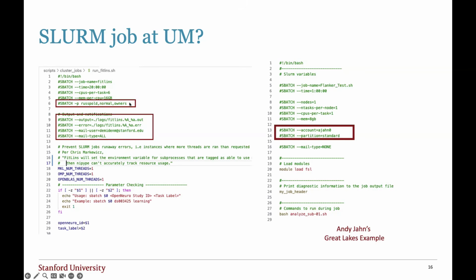But in any case, once you update these two steps, the time component you can adjust: smaller jobs that take less time, larger ones more. The CPUs and memory per CPU, I found this to be the most optimal for it to run as quickly as possible, maximizing both speed and efficiency. Otherwise, everything else runs below. It doesn't need to load any modules because it uses the uv package manager for Python. And I specify some safeguards so it doesn't run away, because I got emails that I was using more nodes than I was requesting.